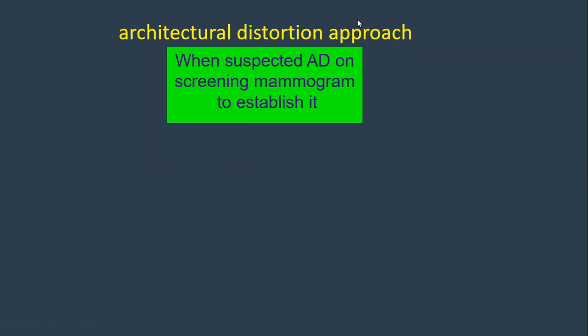How can you establish that this is an architectural distortion? By doing spot compression magnification views. Excellent. Or looking for it on another view. Excellent, well done. So this, you call it as what?